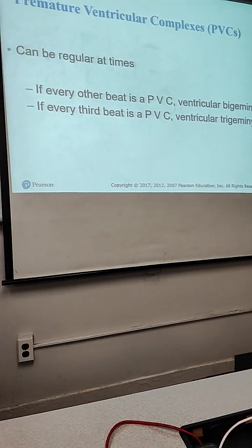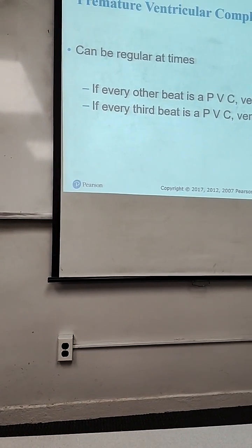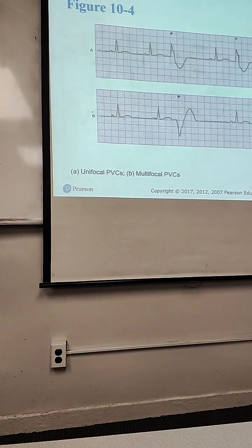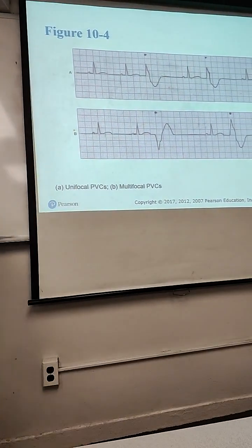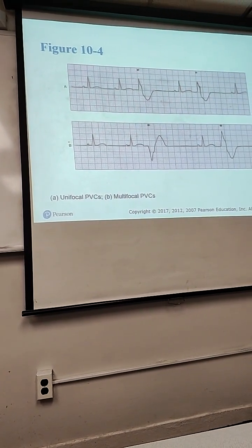Regular at some times. And we saw that. It looks nice, it's just that there is one part that is not looking like this. See? It's just that when you see all this, it looks very chaotic. So you say, uh-oh. The only thing that you know is that this is not normal. You know already because you learn how the normal looks like.